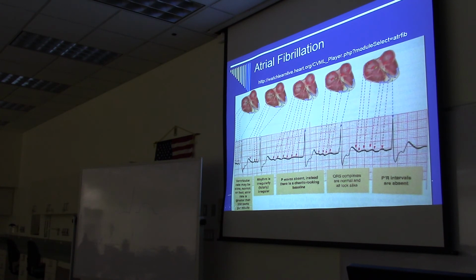So how would you notice you're looking at atrial fib? What you're going to do is look at the distance between your R waves. And when you see that it's irregular, that's going to be your main clue. Your second main clue is that you're not going to see P waves before the QRS.